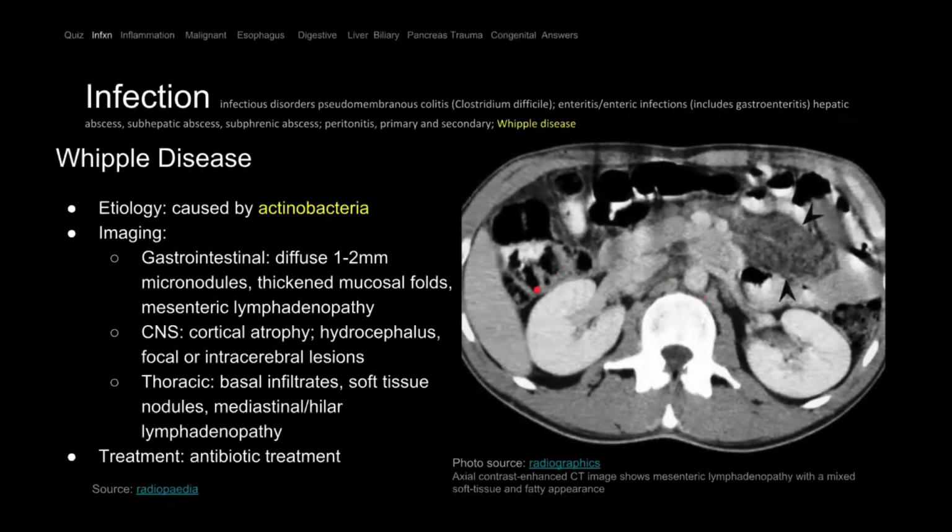So here is a patient who comes in. The abnormality is this, an enlarged lymph node. Lymph nodes typically should be really tiny, and they're kind of bean-shaped. Once they start to get enlarged or look like a ball instead of a bean, then you start to worry about some kind of disease process.